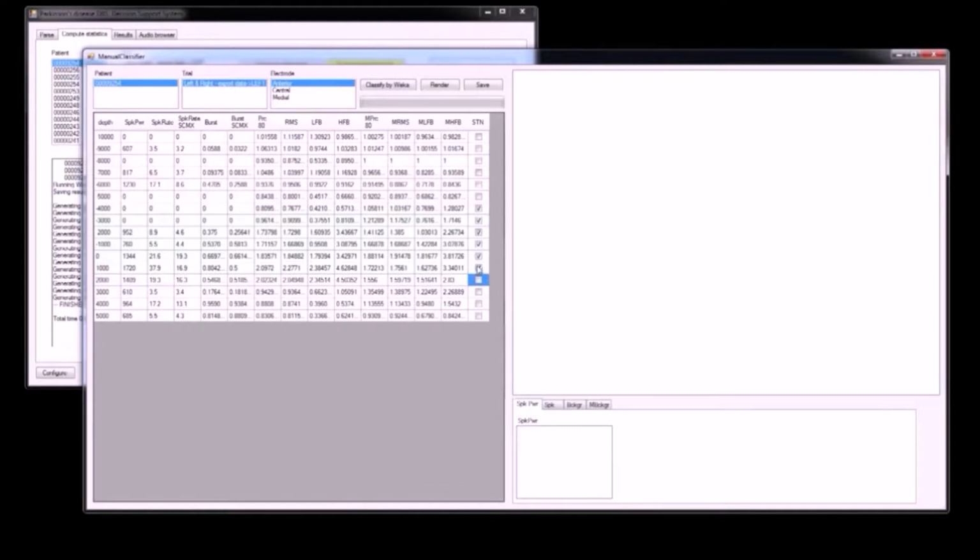You can adjust the selection by adding some selections and subtracting others. After any adjustment, you can save this result, or you can classify again using Weka. This is a way to return to the original state.